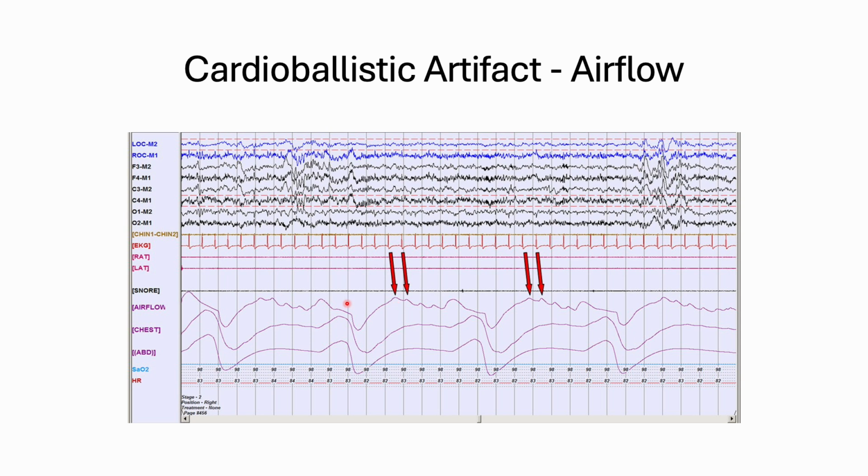So here, this is a CPAP flow, and the mask is on really well. If you put a band-aid on too tight, you can feel your heartbeat in your finger. That's what's happening here.